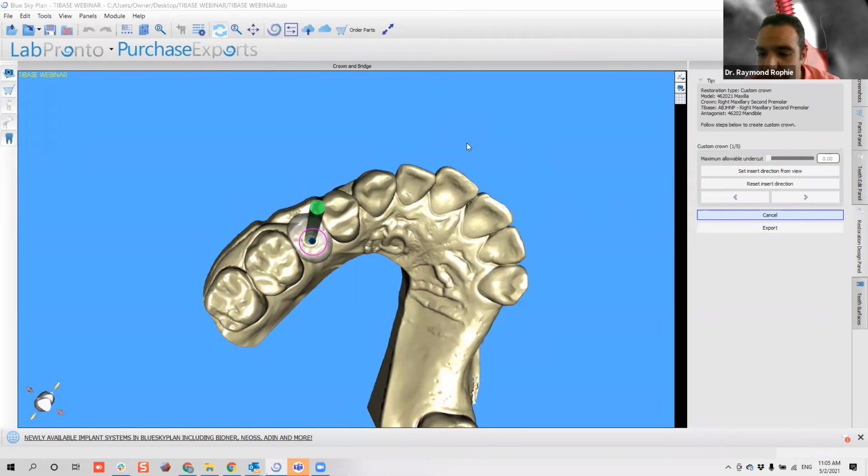So here, this is an immediate implant. Yes, this will be an immediate implant. Okay, or this does not necessarily need to be an immediate implant. This could be an implant that you can just place. It can be an immediate placement, or you can place it subcrestally and just let it heal. And by the time that you are uncovering, you can use the custom healing abutment to plan it. So here you can use it as you prefer.